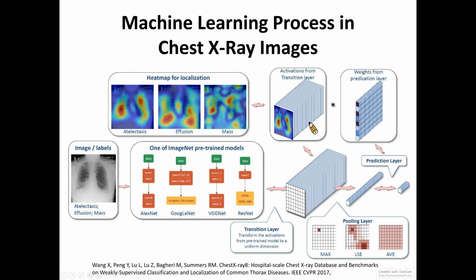And here are the important steps in transfer learning. We need to replace the final layers, because the last 3 layers of the pre-trained network are configured for 1,000 classes. So we need to reconfigure these final layers. We first extract all network layers except the last 3.